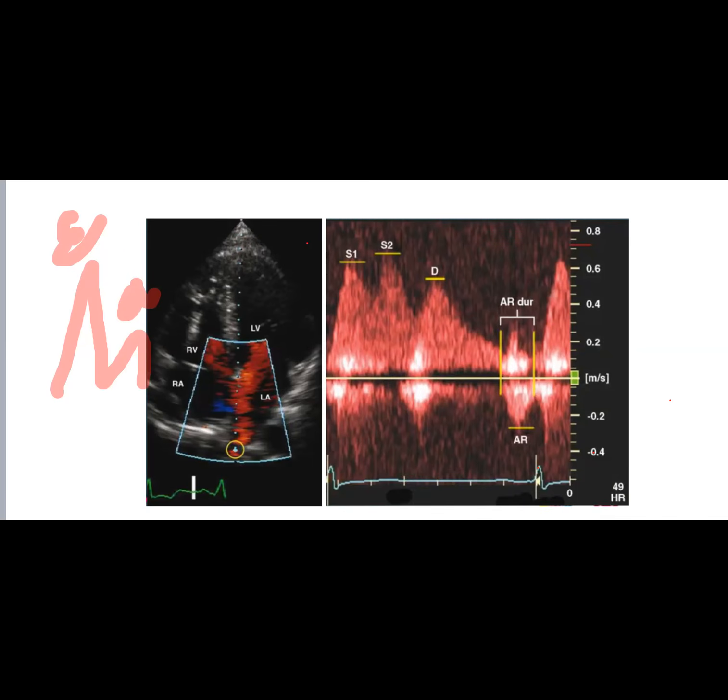Now, when I have diastolic dysfunction, what do I get in the pulmonary venous Doppler? I get more of AR. So more AR and less A. So if the AR minus A is more than 30, that means an advanced grade of diastolic dysfunction. Okay? So this is a great equation we sometimes use.